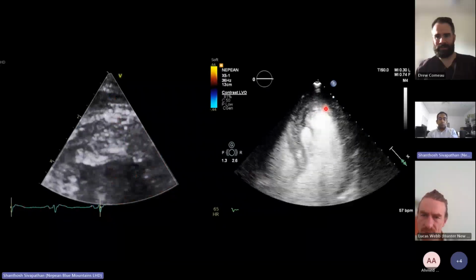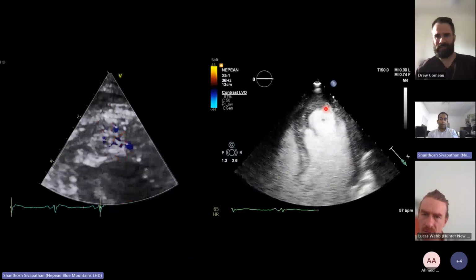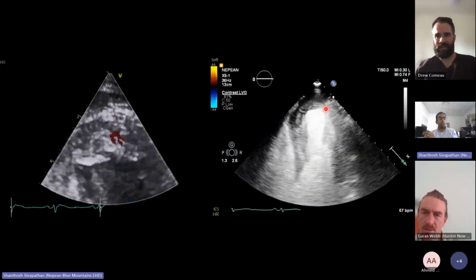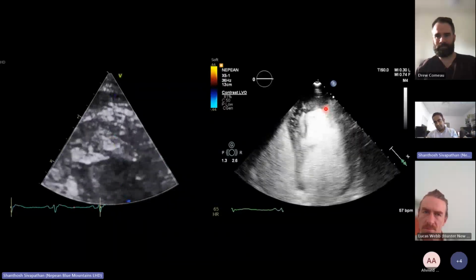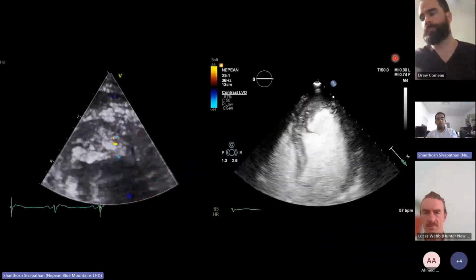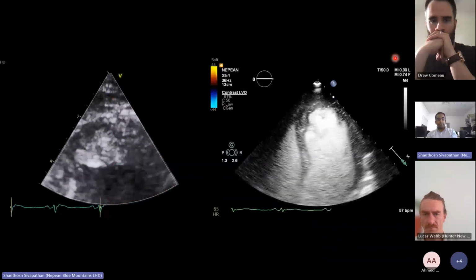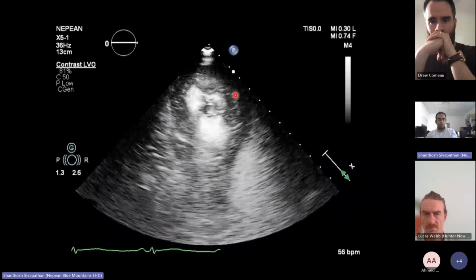And the clue also was that you've had spontaneous echo contrast in the patient who presented late with an anterior infarct. The other clue was he had Q waves, so you know that this is a delayed presentation. He's had an established infarct. So putting it all together, this guy really hammered his anterior wall, and the apex is akinetic, which is really a sitting duck for a thrombus.